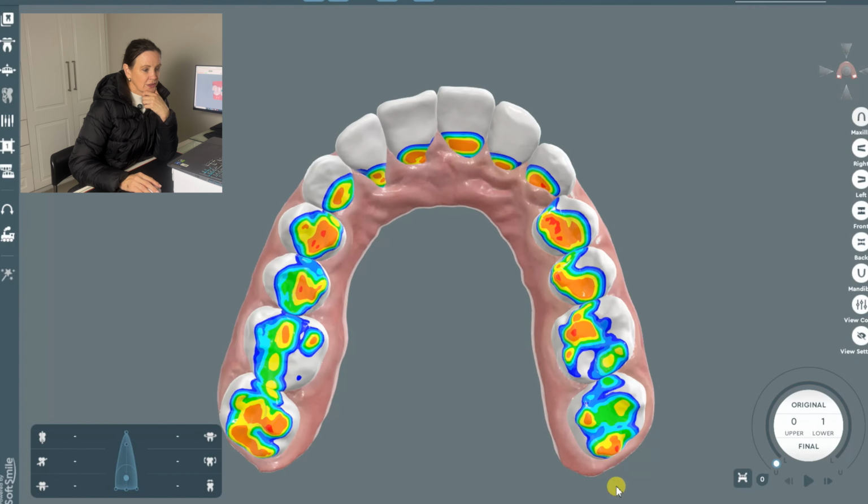Once you start moving teeth, you have to understand, if you take them out of a stable position and you don't create whatever is needed in that position for stability again, they're going to move again. So looking on the screen here, and you look at the occlusal contacts, she's got contact literally on all the teeth. So if I'm going to intrude those bottom incisors, I'm going to take the stability away. They're not going to be in contact with the upper teeth anymore.